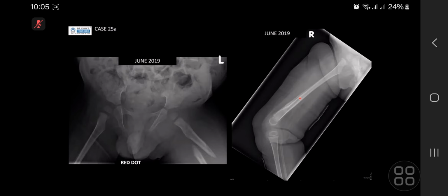There's a fracture of the left femur, which is an old fracture because there are corticated margins along with the periosteal reaction, and there's evidence of soft tissue around that. So this could be a pathological fracture on the left side. Okay, anything else to add? Sparing the epiphysis, involving the diaphysis predominantly.